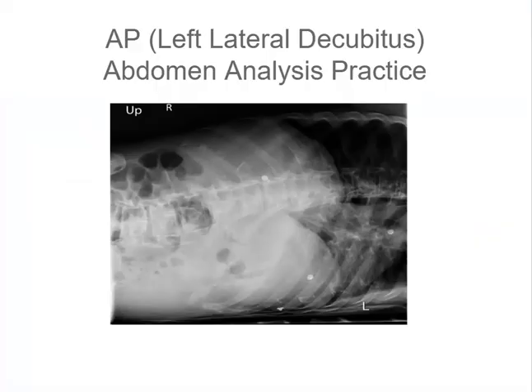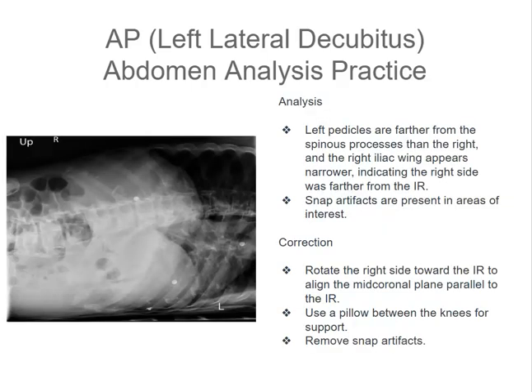I'm going to give you a few moments so that you can analyze this image and then answer the following question. So let's review this image analysis of the left lateral decubitus together. And looking at this image, it's a hot mess express. However, let's get into this.